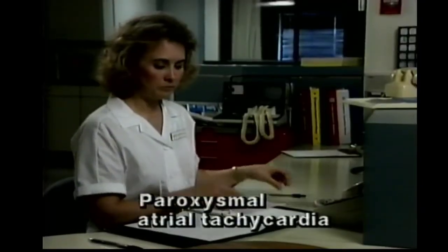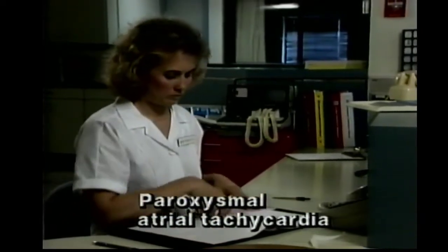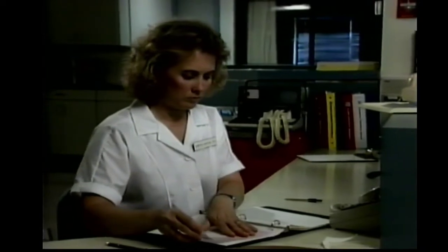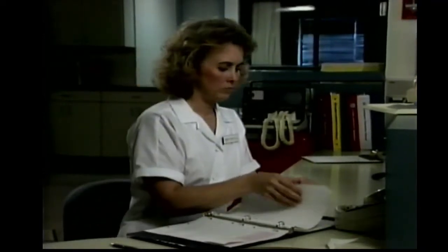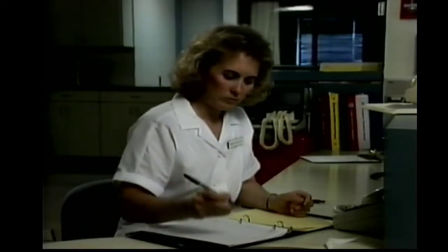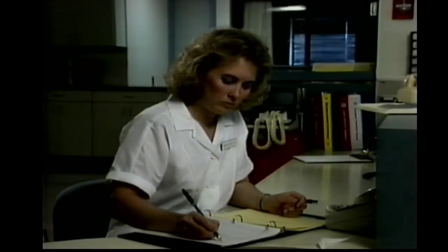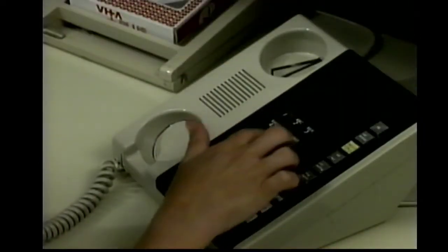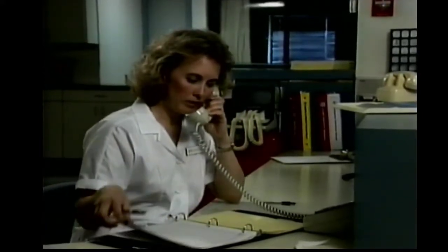This dysrhythmia is paroxysmal atrial tachycardia, or PAT. It is sometimes called paroxysmal supraventricular tachycardia, or PSVT. The rhythm is atrial in origin because P waves are present and the QRS complex is not widened. A rate of 150 to 250 beats per minute is typical. PAT is associated with coronary artery disease, rheumatic mitral valve disease, and thyrotoxicosis.